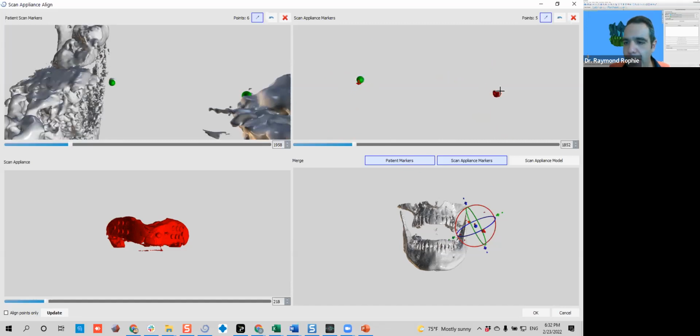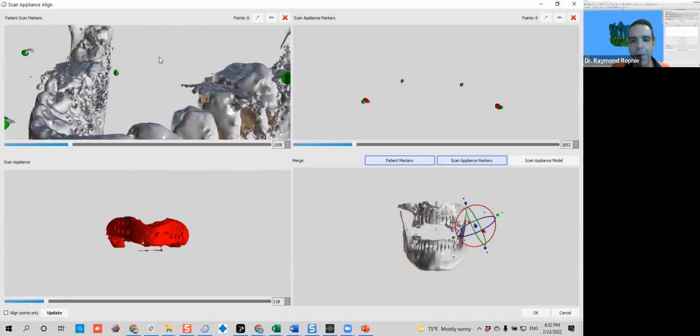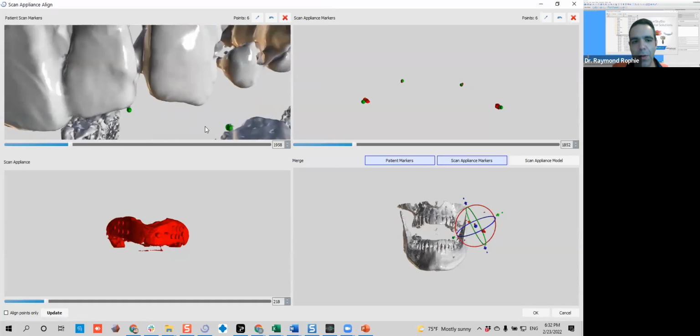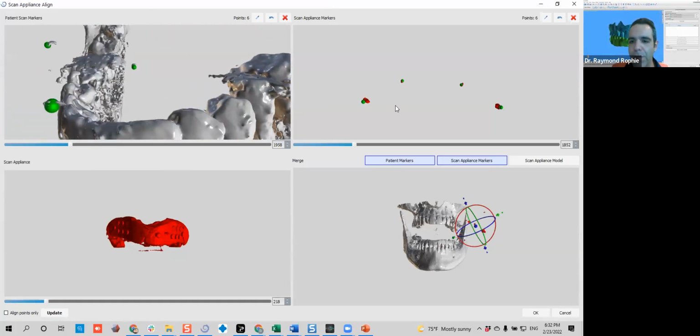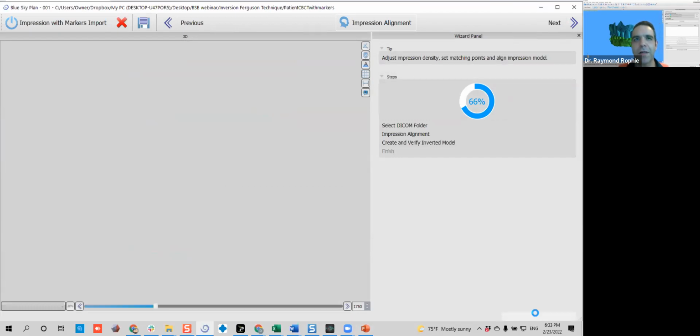As you can see, I am zooming in and out. I am doing this with my right mouse button, okay, zooming in and out, and centering the window position. If I click the mouse wheel, it will act as a button and will help me with the translation of the models. Okay, I really like, when we're designing in CAD, positioning everything in the middle. Okay, good. Sorry for all this long initial part, but I am just trying to address the top questions that I receive on the phone every day.